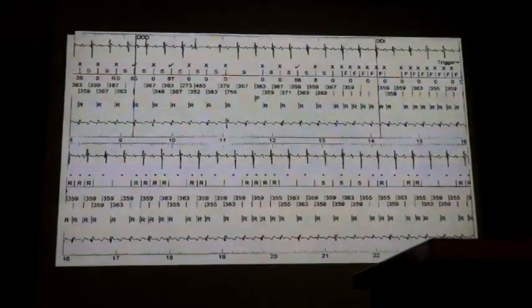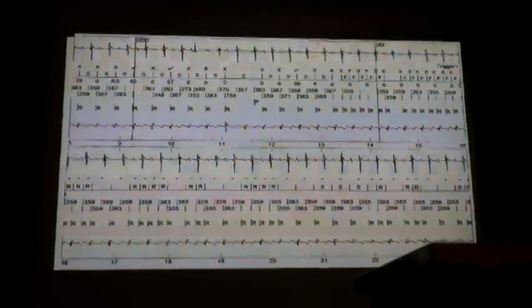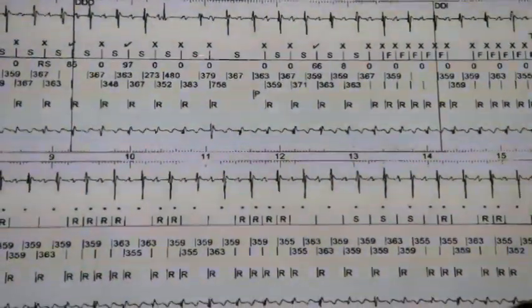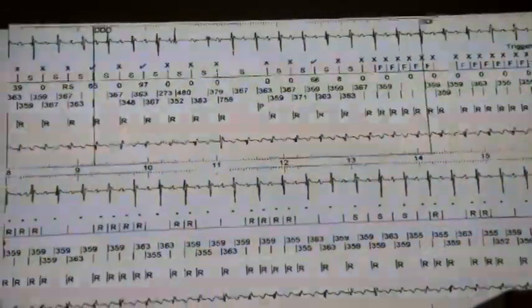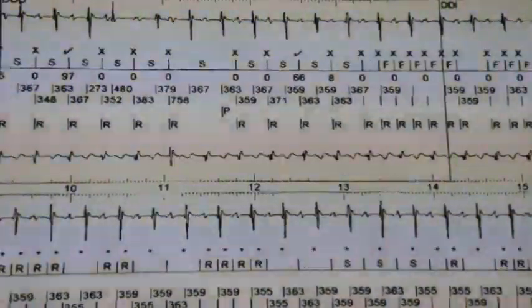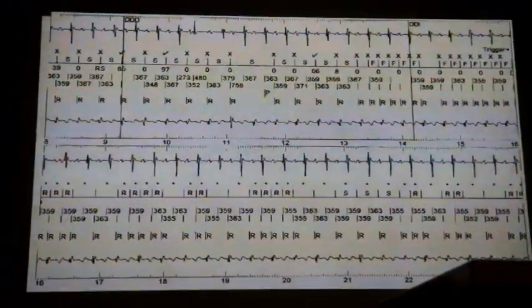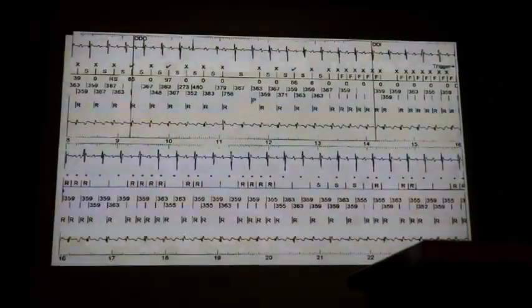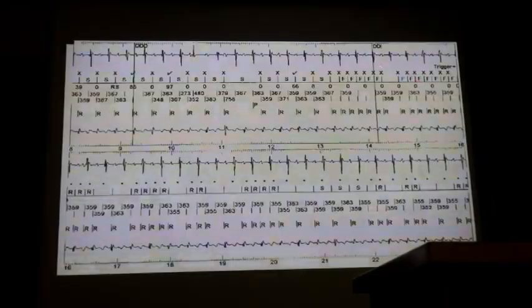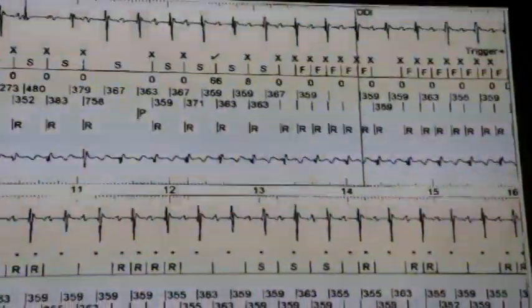Let's elaborate just on the markers, the ones with the S. This is the classification. This is saying that this RR interval is in the sinus zone, which is any zone lower than the VT zone or the VF zone. Fib is in the fibrillation zone, and blank means that there's a mismatch between the actual interval and the average interval. It's one of the binning rules on an Abbott device. If you go into the cardio cases, it'll explain that algorithm in detail. But it is sensing in here. It's just not classified that RR interval.